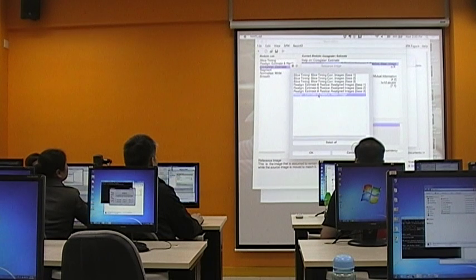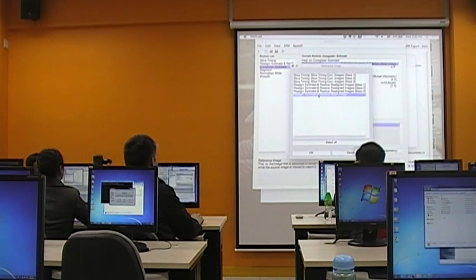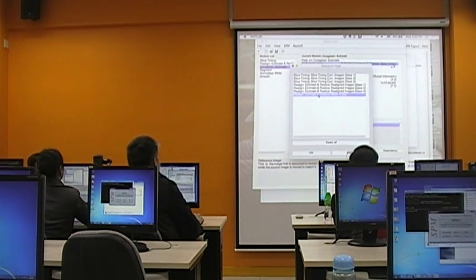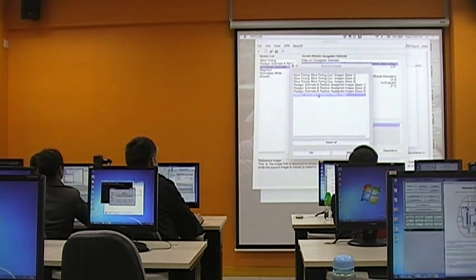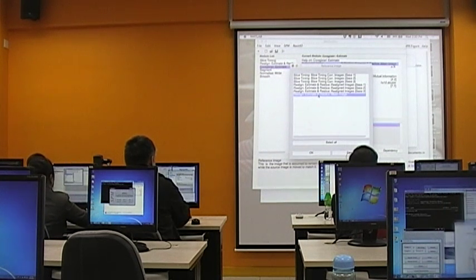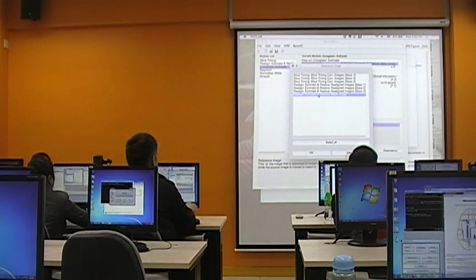But the goal of this co-register step is to bring the functional images to the orientation and location of the T1 high resolution structural image, so that later on when you do segmentation on the T1 or the structural image, you can apply this transformation or normalization parameters also to the EPI, since they are in the same space after registration.